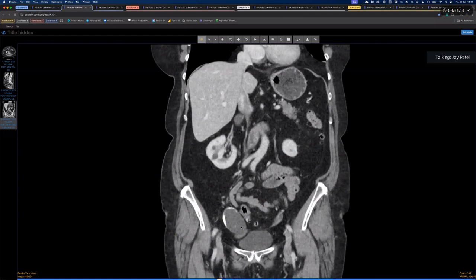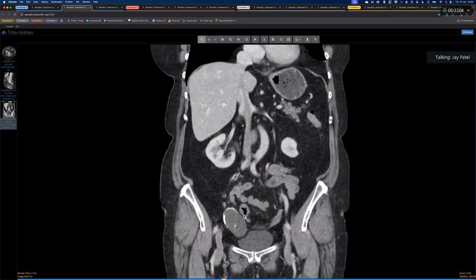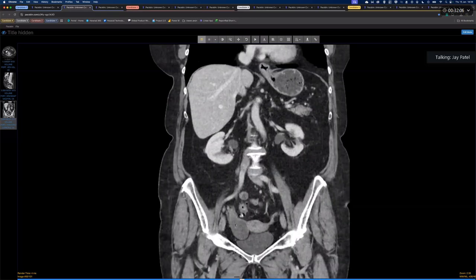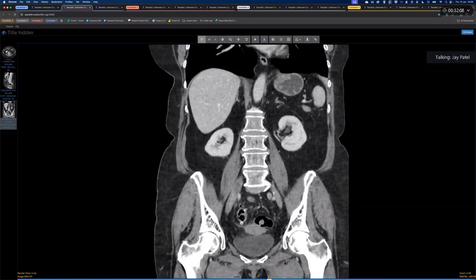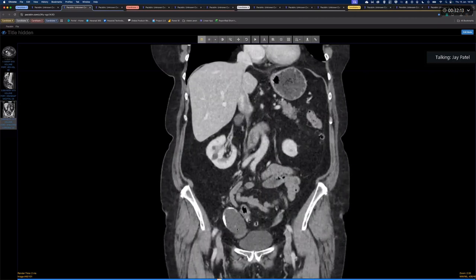It's unusual, however, to have mucinous fallopian lesions. In fact, fallopian malignancies are actually pretty rare and typically present late with widespread disseminated peritoneal disease by the time they present. They don't typically get calcified mucinous lesions or calcified cystic lesions like this within the fallopian tubes. So the learning point here is cystic tubular type structures anywhere in the bottom right quadrant.